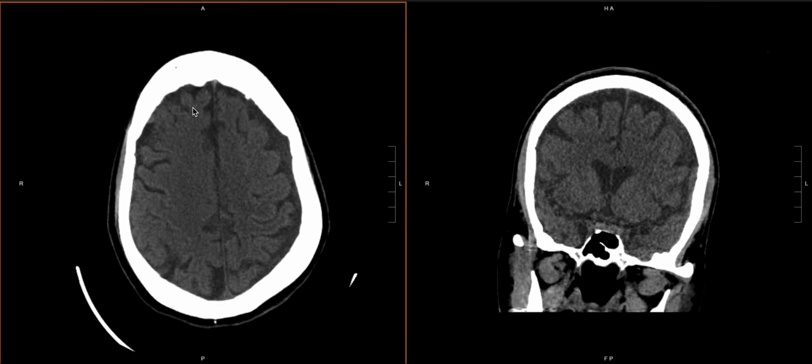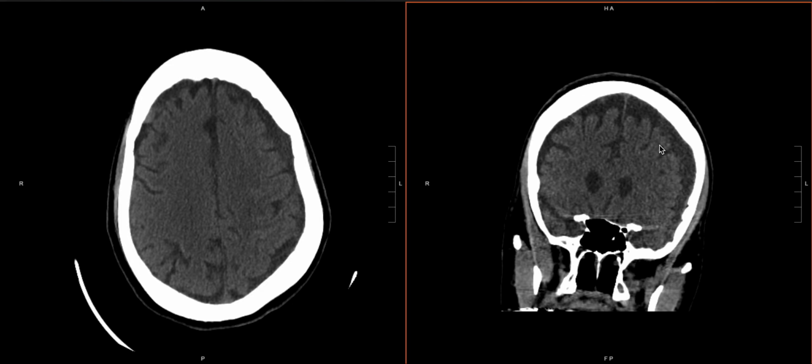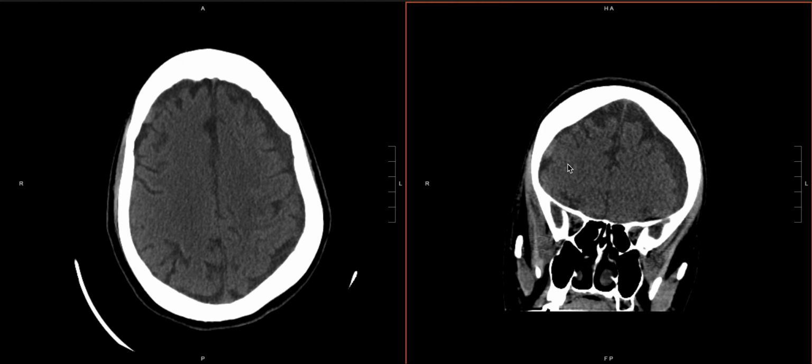So again, window appropriately, look at your reformats. These are large enough where you can catch it on both the axial and the coronal, but on the coronal you see some of this acute component. Again, it's caught in plane, so we see more of it at one time, and it makes it more conspicuous that there is subdural, acute, maybe subacute blood products here on the left side, and then also on the right. So look at that. So that's all hyperdense blood.